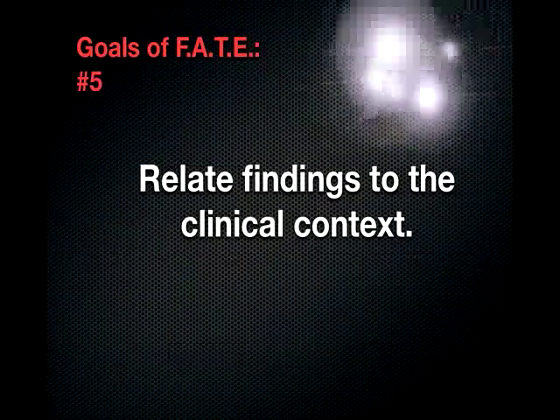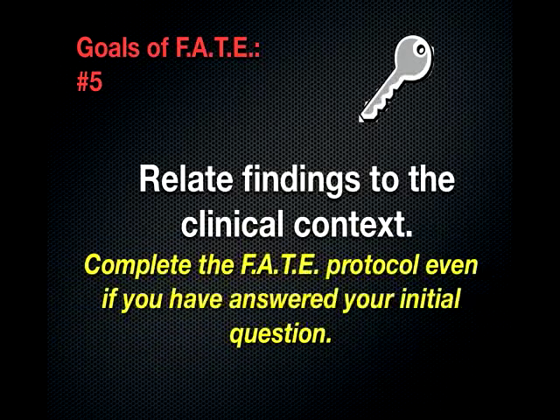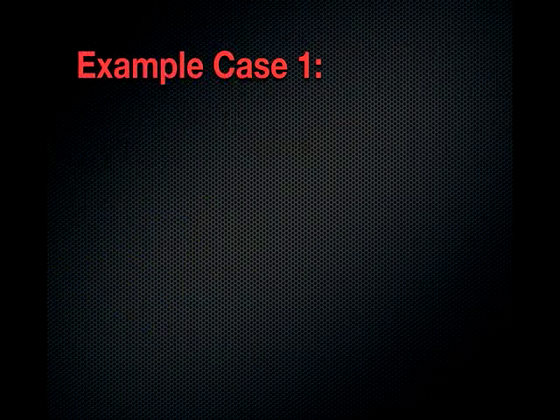And the fifth goal is to relate the findings to the clinical context. So if you have a particular question in mind and you start your exam and you think you've answered your question, I encourage you to do all three views of the heart and the views of the pleura, because you may actually come up with some other information that guides you or reinforces your beliefs.